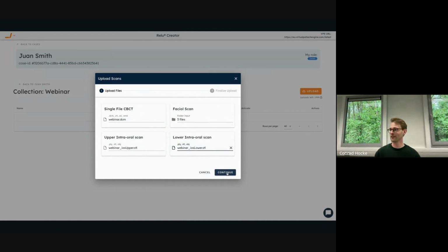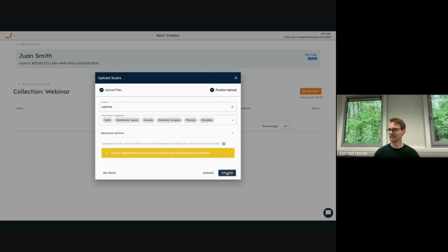Okay, now that I've shown you what to upload, let's head to the advanced options when you decide in the next dialog.